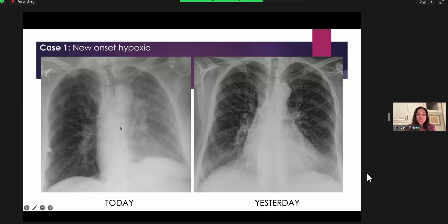I haven't decided which side yet. With your typical ICU patient, they usually have low lung volumes and increased attenuation, so I don't want to exclude that this could be the abnormal side, but I definitely know that one or the other is abnormal. The other thing I notice is that the volume on this side is much smaller than the volume of the lungs here. Normally your left hemidiaphragm should be lower than your right hemidiaphragm. The right hemidiaphragm sits higher because the liver is below it.